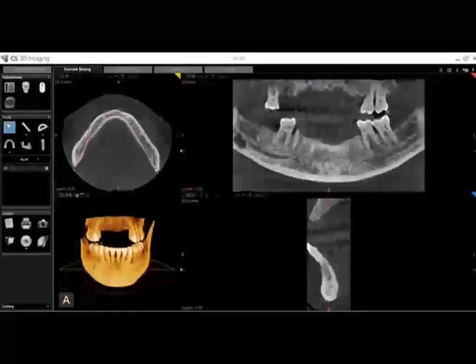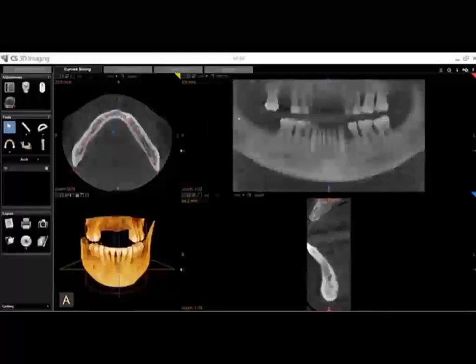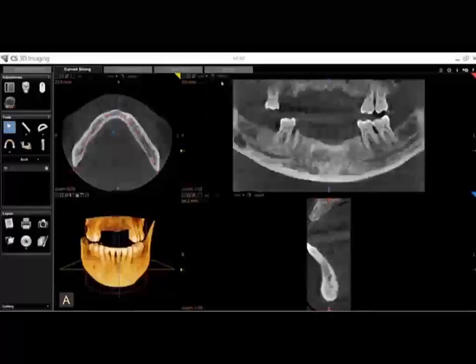You should now see two additional images on the right side of the screen, a panoramic style view and a transaxial view. The panoramic image may look a little strange, as in this example it is only a 180 micrometer thick slice along the arch curve that we defined. To make it look more like a traditional radiograph, you can always use the Set Integration drop-down to increase the slice thickness. Use the same drop-down to change it back.